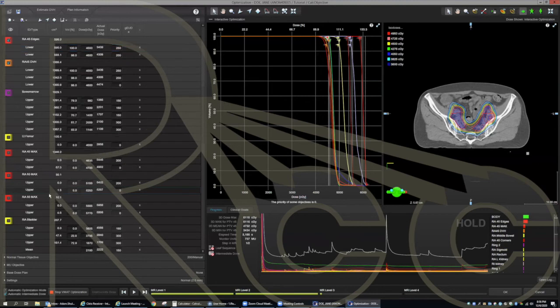So my max doses, let's see what this looks like. Here's my 50 max. You see it turning on and off. This is 5% at 105. This is 105%, 5%. So it looks pretty good. And my 55 turning on and off. Again, this is 105%, 5%. Looks pretty good. I'm not going to worry about lowering those right now.